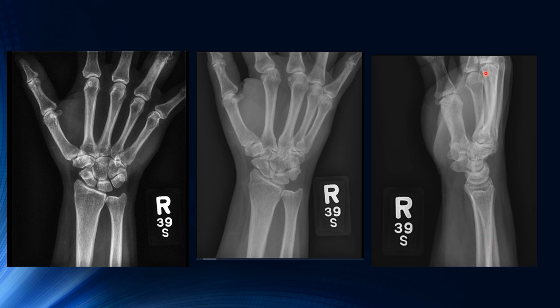The hand actually looks decent for the lateral. The radius and ulna are superimposed over top of each other. You can see the lunate here. Metacarpals over top of each other here, and no flying thumbs. The thumb is in good position here.